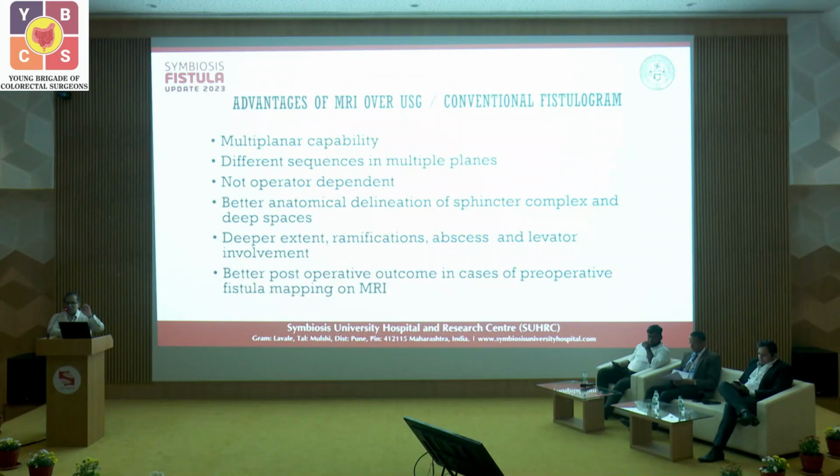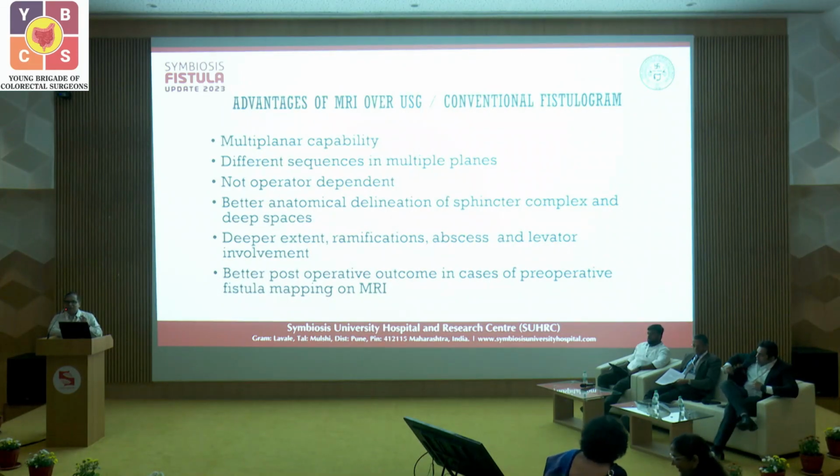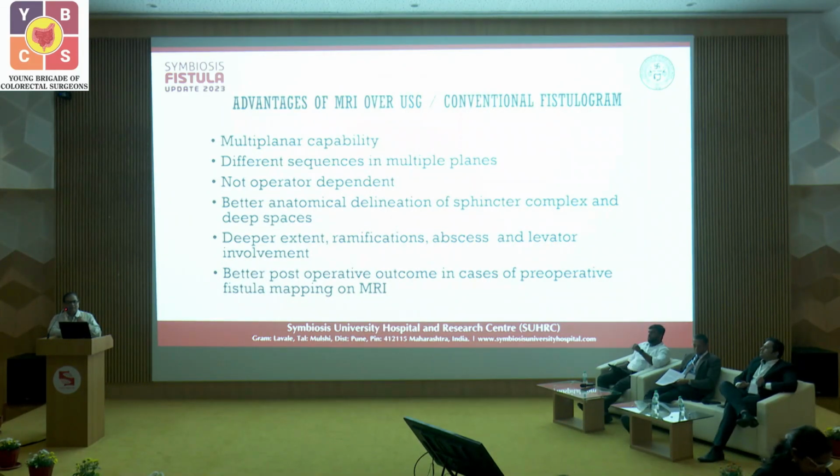It is not operator dependent, especially compared with ultrasound. We can do a transperineal ultrasound or an endoanal ultrasound, but again it becomes specific to the operator, and it is very cumbersome for the patient. As sir said, it is very difficult even when you do a PR examination. So imagine the plight of a patient when you put the probe in the anal canal and how painful it will be. Just for diagnostic purposes, we don't want the patient to suffer much.